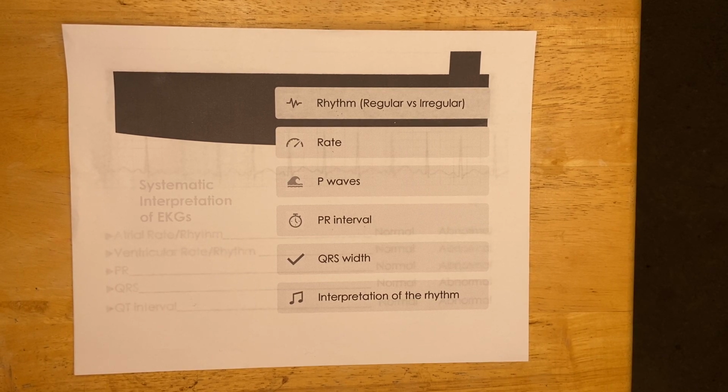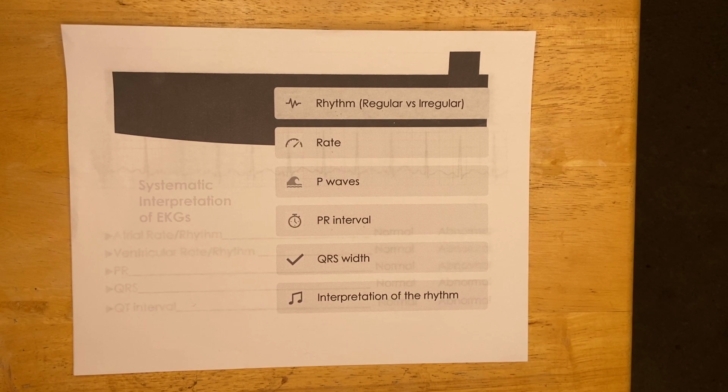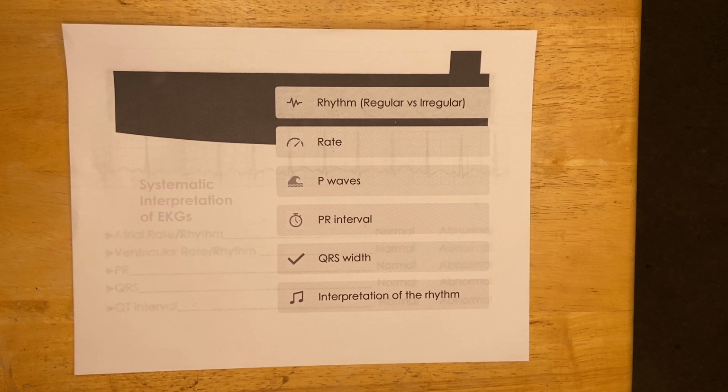There are some rhythms that you can do that with, and we're going to see that when we get down into lethal ventricular rhythms. But there's also a whole lot of rhythms that you are going to miss if you just try to eyeball and recognize what you think it's going to look like. Just like if you played a sport and you had to do drills, or if you played an instrument and you had to learn to play scales, we're going to go back to the basics of how to measure.